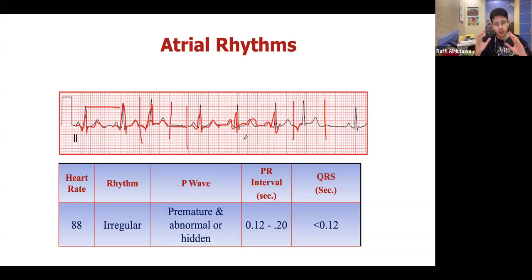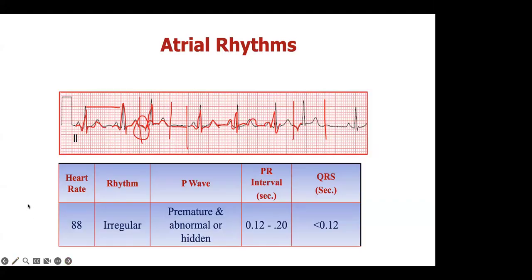But you have these premature contractions. So these interruptions in a normal sinus rhythm, this is a premature contraction. To decide what kind of premature contraction it is, we look at the morphology of the QRS. And here we see that the only abnormality is the inverted P wave. So we say it's atrial. Does that make more sense now? Yes.